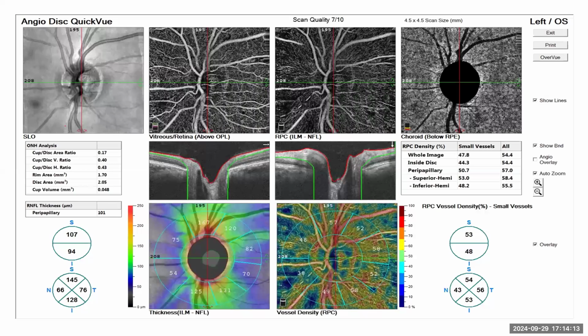I want questions on this scan regarding the vessel density. That way, I'll be sure that we're on the same page. Anyone can type into the chat, or 1 or 2 persons can unmute and then ask a question. If there's any part of the scan you are not sure of, relative to the optic nerve head and glaucoma, please go ahead and ask your question. In attending to it, I may be able to clarify a few things further.